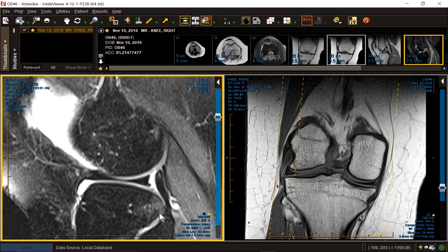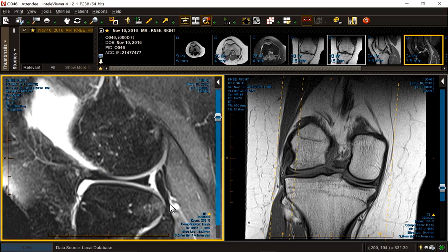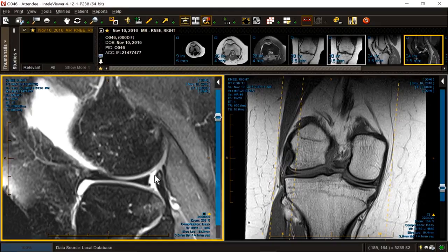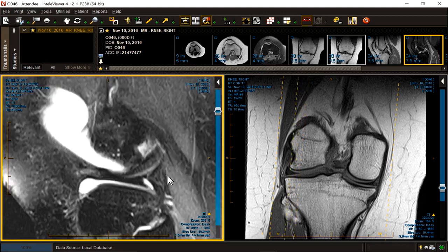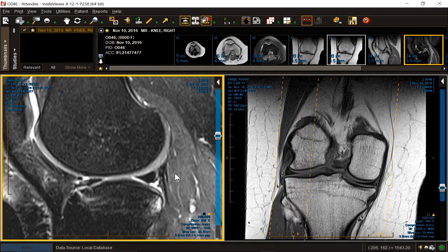How's our posterolateral corner looking? Quite good. We've got a nice, thick popliteofibular ligament. For when it tears, it'll roll up in a ball like this, and you'll get a little tail to it. It'll be transected off the fibula, and that's known as the mermaid sign. We've got a little swelling in the arcuate fossa. There's the arcuate. It's okay. It's normal. There are two limbs to the arcuate, which we'll show you in our next corner case.